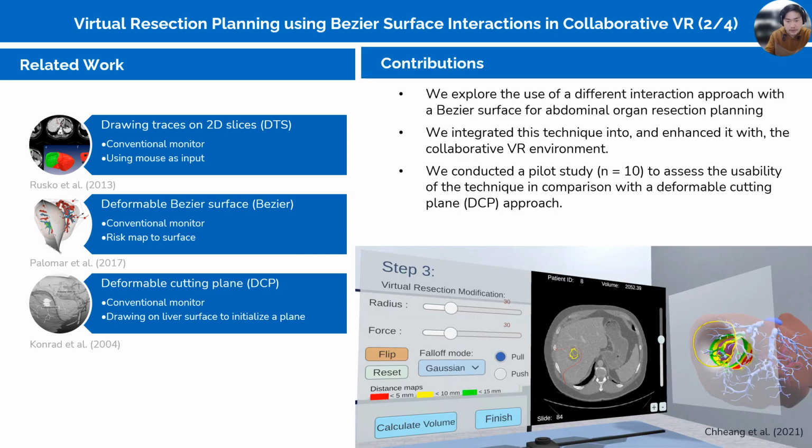However, in this work, we explore the use of a different interaction approach with the Bezier surface for virtual resection planning. We integrated this technique and enhanced it into the collaborative VR environment, and we conducted a pilot study to assess the usability of the technique in comparison with the DCP approach from previous work.